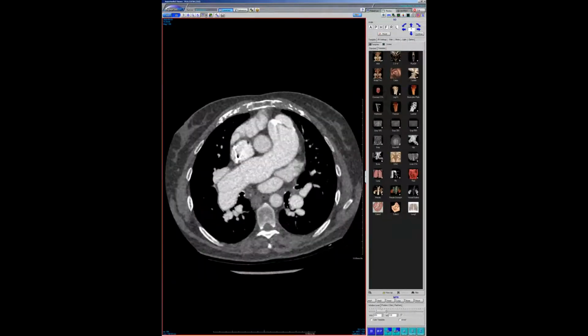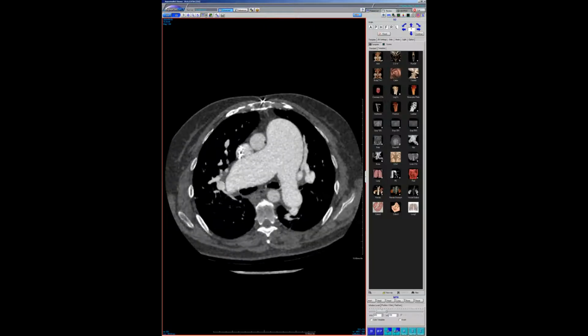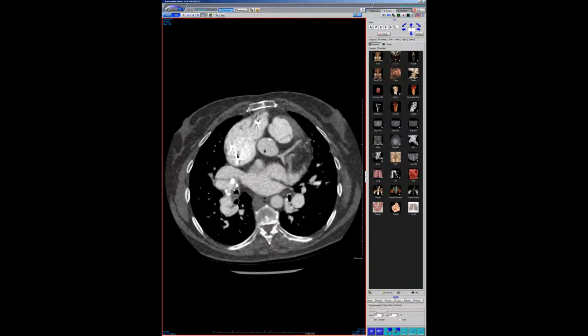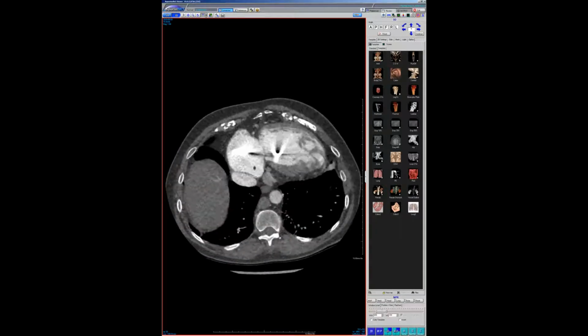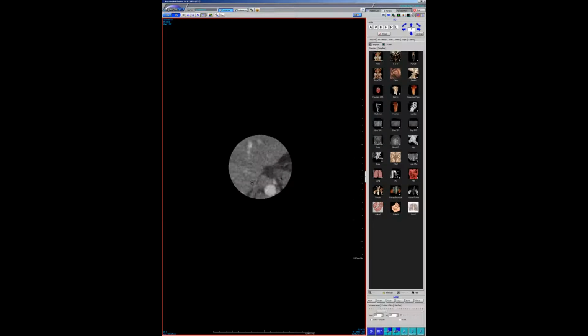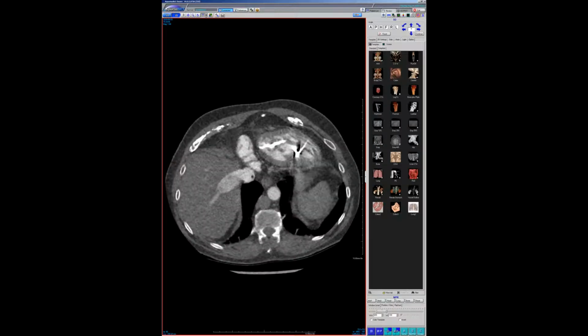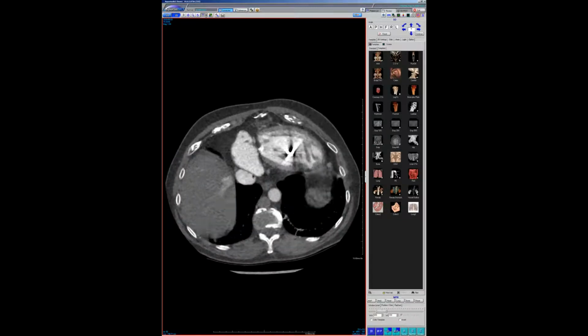It also shows the importance of, I mean, we all miss stuff. I understand that. Especially when you're outside your specialty, and especially if you're outside your specialty reading a belly film. So this patient has had a couple abdominal CTs over the years.